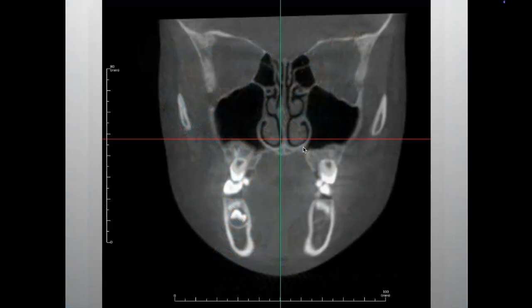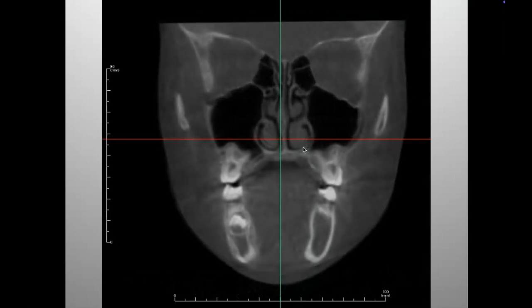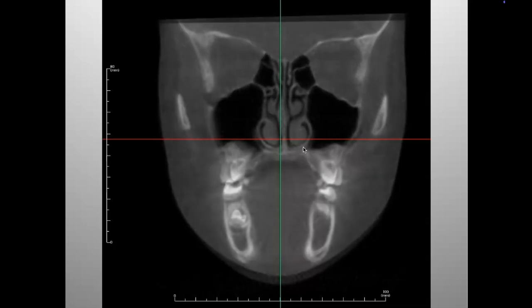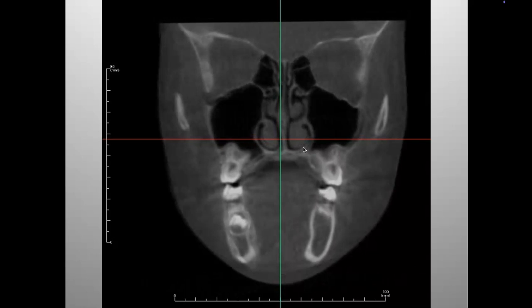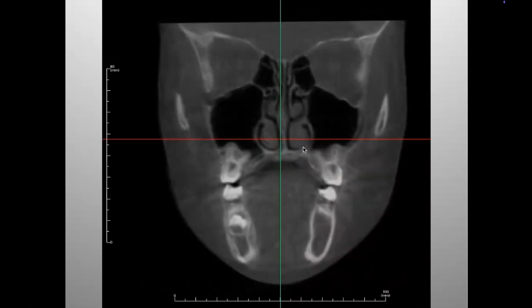And so this is the superimposition of the width here. So you can actually see the changes in the bones. Now, we talked about as the maxilla expands, it typically comes down and forward. Almost always in adult, with adult orthopedic expansion because the resistance is higher. Growing kids, you'll see there's more variation in the changes that happen. So you can see in this case, there's definitely a big change in the vertical component of her growth, right?